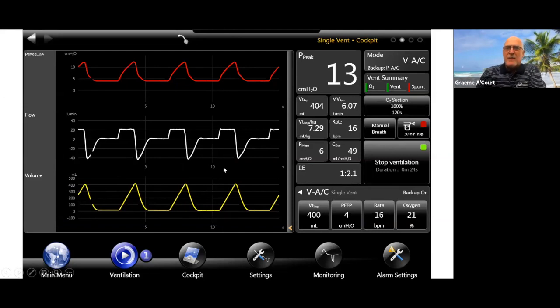So what I've thrown in here is some of the issues of monitoring, what we're going to monitor. When I play with ventilators, I like to look at what we can monitor. So we have some basic settings, some basic waveforms. Over here, I like the ability to make adjustments, so this can be configured to what I like to look at. Obviously, volume in, volume out, that's no big deal. Minute volume. I like to put in the patient's ideal body weight and gender, so we can calculate the ideal tidal volume in mL per kilogram, because there's a lot of error when you ask people to guesstimate. Do they do this correctly? You hear people say, oh, we put in height to get ideal body weight, but do you put in gender? Because you actually get a different formula. A lot of people don't. So that's important too. And then of course, mean airway pressure and compliance, or dynamic compliance. Any thoughts on these sorts of measurements?